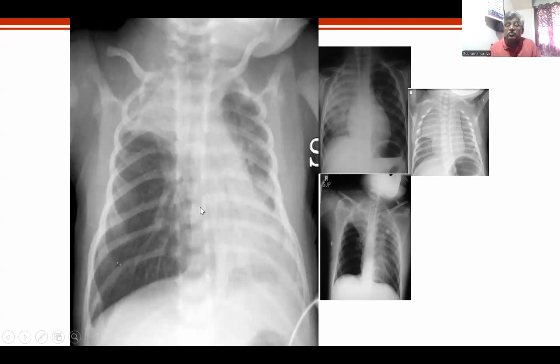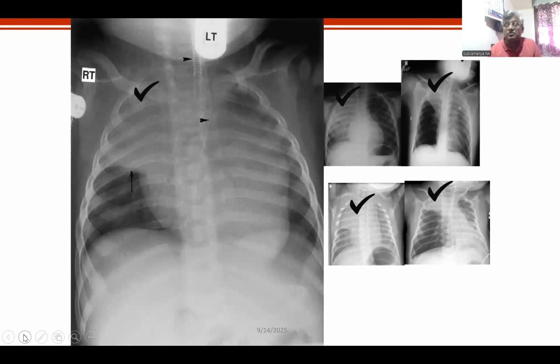Now, it's not just that this is over. Actually, let's look at the left lower lobe. There is a consolidation here, which is again missed. This is a patient who has consolidation of the left lower lobe, right upper lobe collapse consolidation plus thymus plus compensatory hyperinflation of the mid lobe. This is the complete diagnosis, but often you can miss. Now, let me go to one point, that is the sail sign. Beyond the sail sign, what you see is collapse or consolidation, and that is number one. Number two is compensatory hyperinflation, and that's most important.